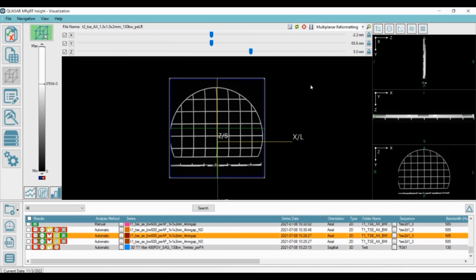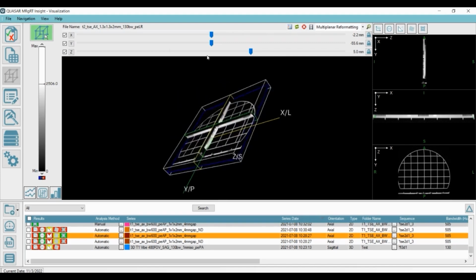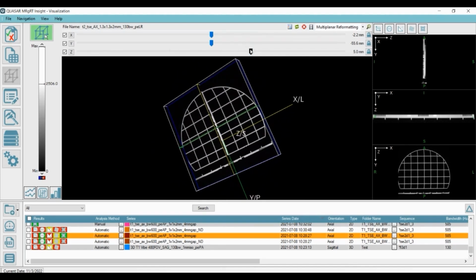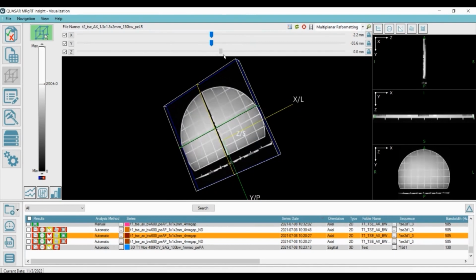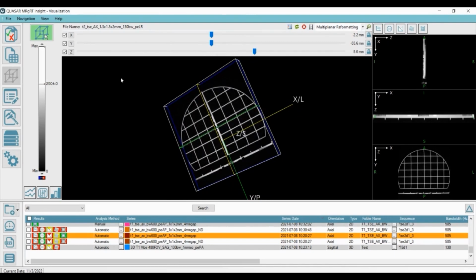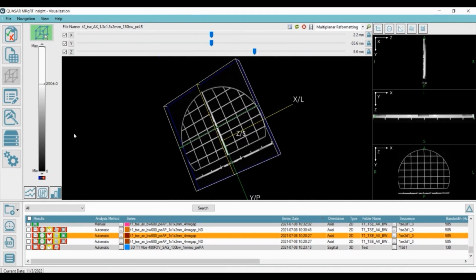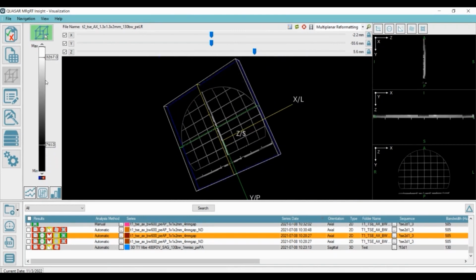And so within this space, you are also privy to moving the slice around. So for example, like this, you can also rotate it. You can drag it through the different planes to see different slices and such. You can zoom in and out by just simply adjusting your mouse, and you can also adjust the window balance as well.